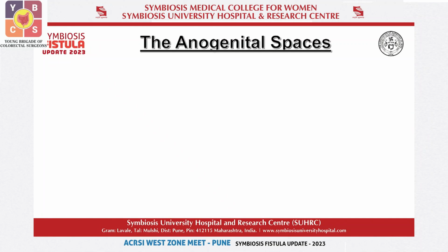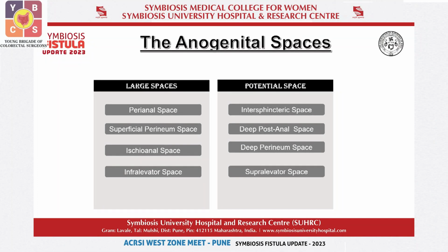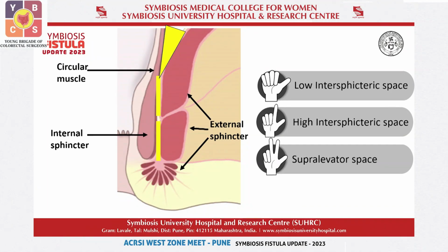These are all anogenital spaces we have actually seen in the morning in the discussion, okay? So we'll see how they look on MR, okay?